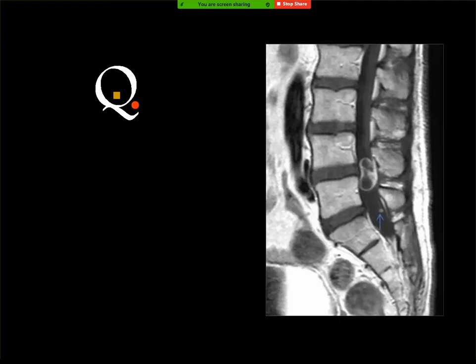Sagittal MRI of the lumbosacral region. Yeah. This is a neurofibroma, I think. Sagittal MRI, T1 post contrast. Yes. And this MRI is showing mild enhancement with cystic degeneration, neurofibroma. Okay. It is a subdural lesion. Yes. This is an intradural or subdural pathology, and this mass is partly cystic and partly solid.